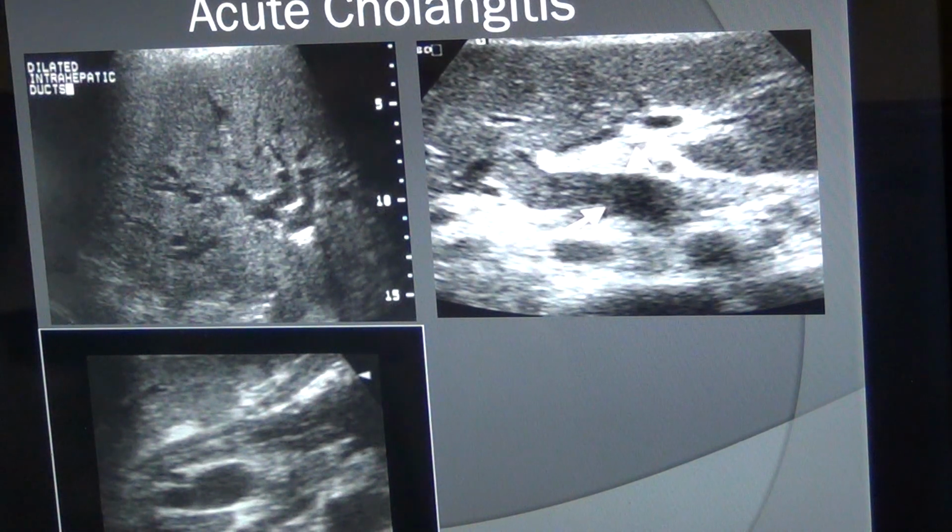It could be obstructed at the junction of the porta hepatis, at the junction of the right and left hepatic duct. There might be a tumor, Klatskin's tumor, or lymph node enlargement, or any other tumor obstructing the common hepatic duct.